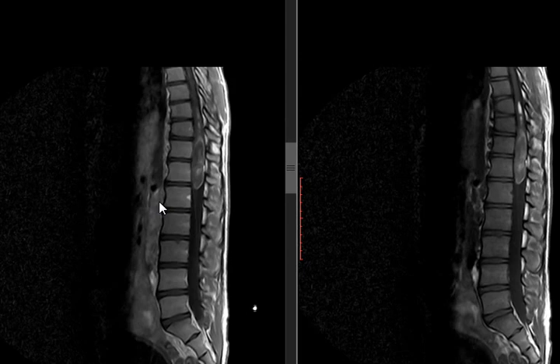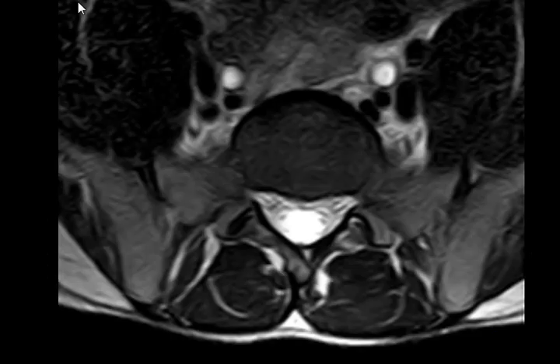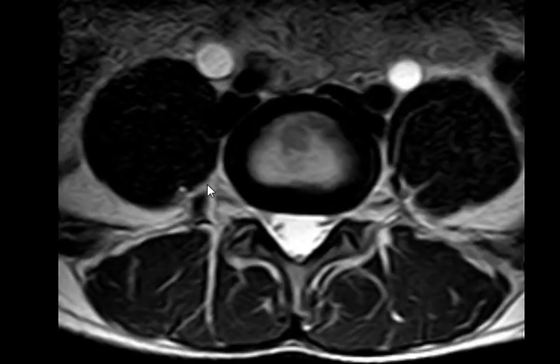However, there is something that, as we said, these neurological things, they don't come alone. There are some other associated abnormalities, like congenital. So, there is something else that you missed. Alhamdulillah, I didn't miss. Let's see. What other abnormality does this patient have that you can perfectly see on the axial images?